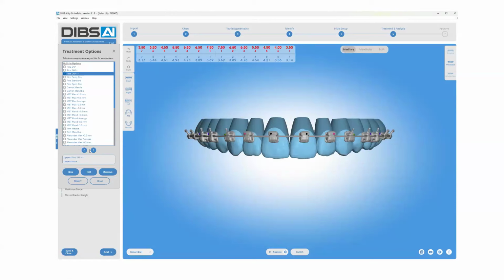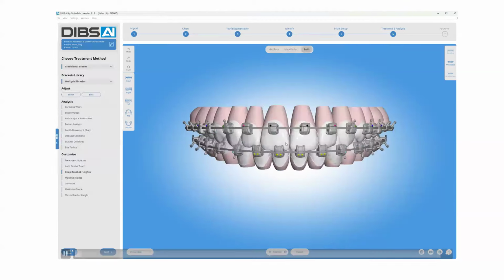And here is a Pitts SAP++ bracket placement. And there you get to see your pre-treatment visualization of kind of what's possible with the smile arc with this case. And it's just kind of the real-time predictive treatment planning that has just opened up a whole new world for me.